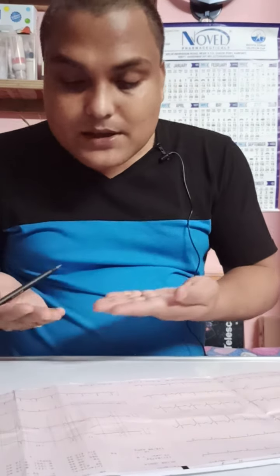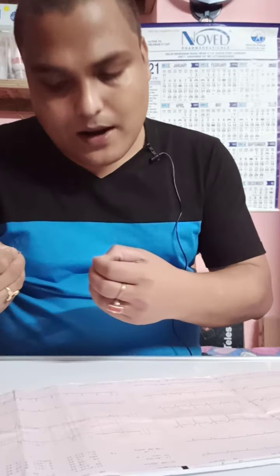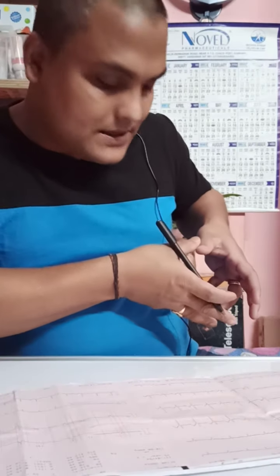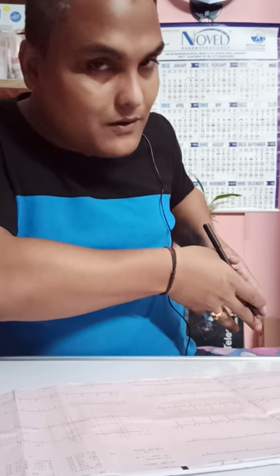Now the QRS complexes, if you go from V1 to V6. The arrangement of the heart is like that: the ventricle is placed a bit to the left and a bit posteriorly. The R wave is because of left ventricular depolarization.